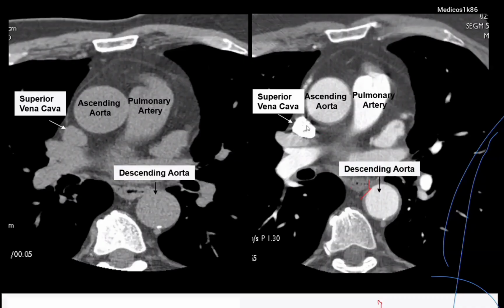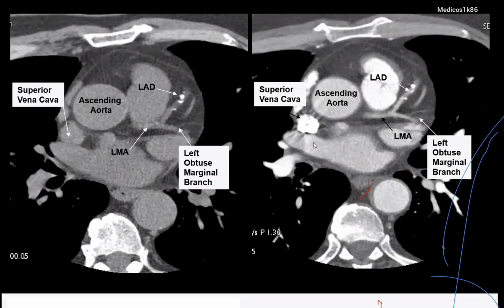And also you should know this is the real scan. During the bolus tracking scan, because of the low mA, there will be more artifact. Okay, I'm going down. You can see the streak artifact. It is coming more wide, and then it is giving a higher Hounsfield unit in the aorta, and then it is starting early. We have to be careful on that part.